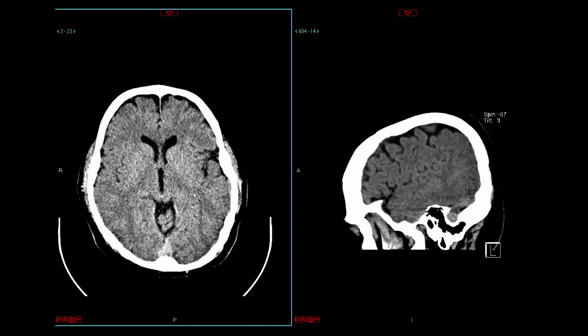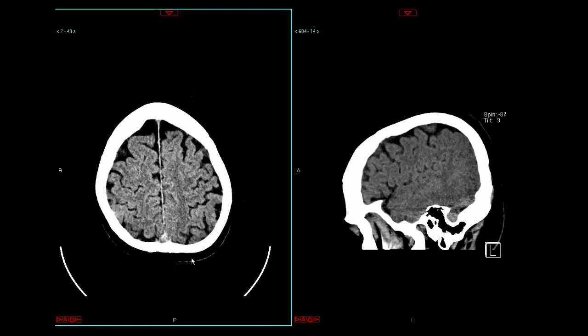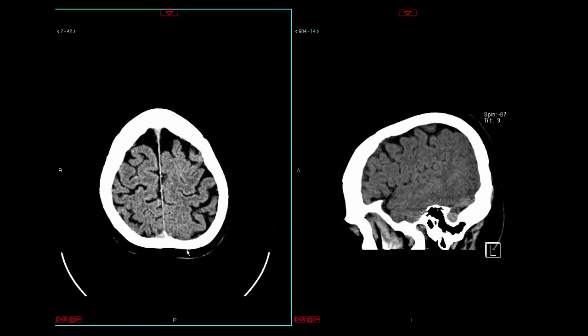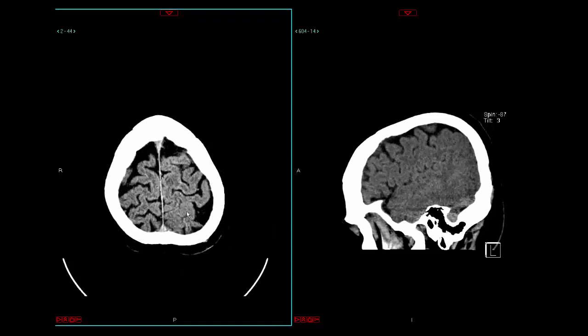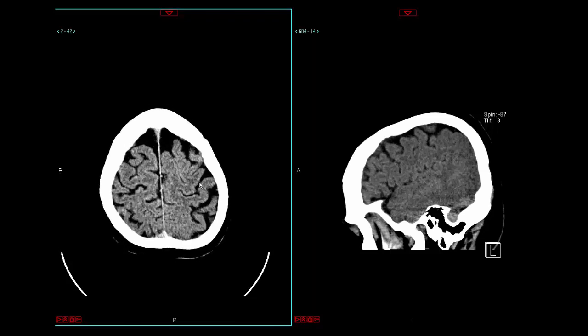So that's going to wrap it up for the basic sulci and a few basic gyri of the brain. Again, great if you can get your first landmark here with that inverse omega sign marking the central sulcus. Once you have that, scrolling back and forth a little bit really helps you out in identifying some of the more prominent structures that may come out.